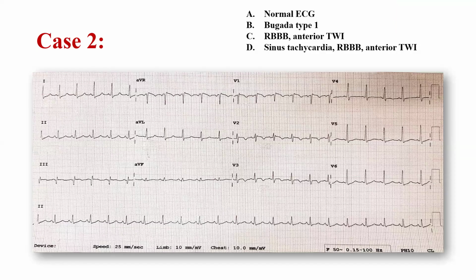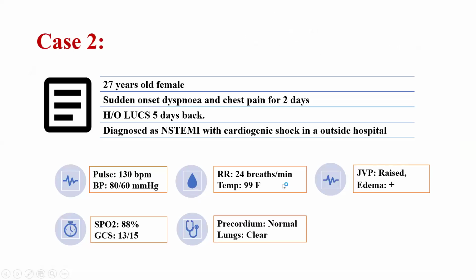A little background he has put. A very young woman, and with this ECG, before moving on to the T wave inversion pattern, we have to look at the thing.